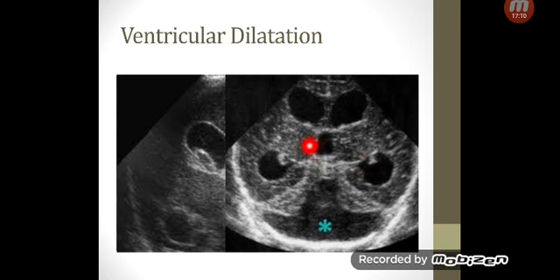So all of the ventricular system is dilated: lateral ventricles, posterior horns of them coming up again, and then the third ventricle in the middle being dilated, and the fourth ventricle is dilated. But what is really important is where the star lies. So what is happening there? Basically, there is no cerebellum, and this is a Dandy-Walker malformation.